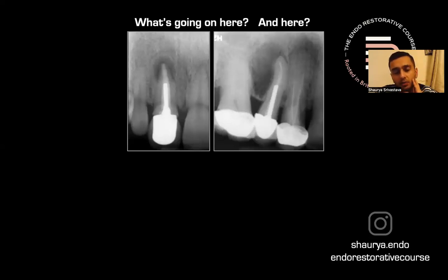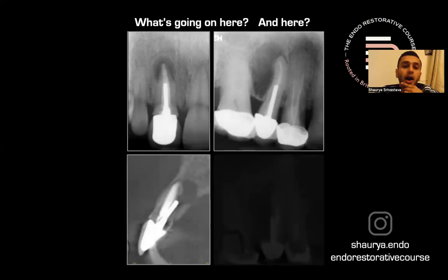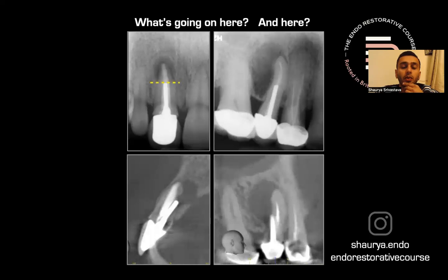So we took a scan. And that's what we see here. That's perforation there. And as suspected, when we look at the image on the upper left, where the post ends, the lesion begins. That's because that's perforation. The image on the right side, see where the post direction is. It's a little bit off-centered. That's where the canal space normally would be, and that's where your post is going. So that's an indication again to refer for a scan.